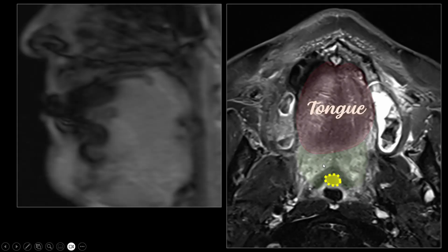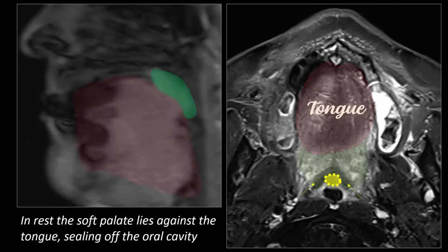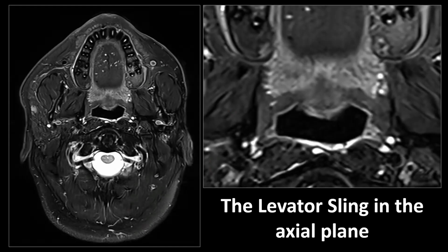And you will see, and this can be a bit confusing on actual images on CT or MRI, the soft palate in rest immediately lies against the back of the tongue. So we don't see air between those. We have these soft tissue structures lying next to each other, or on top of each other. We have the tongue here, and then the soft palate lying immediately on top of it, sealing off the oral cavity, which can make actual images sometimes a bit more difficult because you don't really understand what you're looking at.